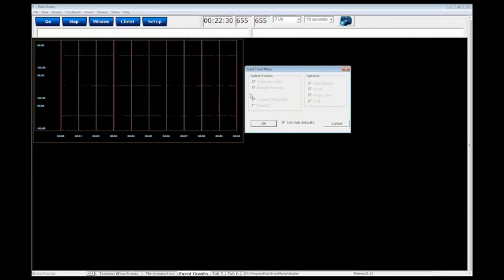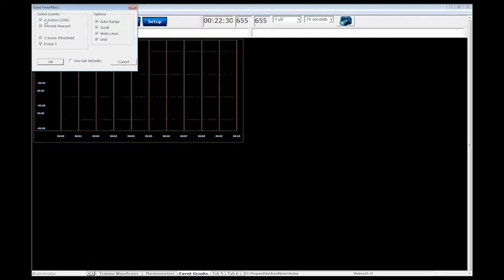In the older software, there was no way to control how the graphs displayed on each other. There were some ways, if you did something certain ways, you would have them all together. If you did them this way, they would be separate. So the panel itself has been redesigned so that they're stacked one on top of another. And I will show you later how you can have them all grouped together, or you can keep them stacked onto each other. But one of the things you can do, for example, is you can turn off your tab default. You can choose to have more, you can choose to have less, you can turn off the auto range feature, and you can also change how it's scrolled as well as how large the lines are.